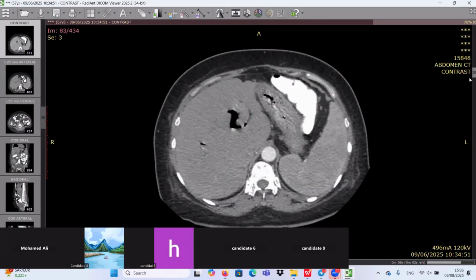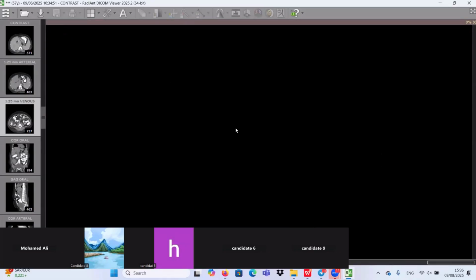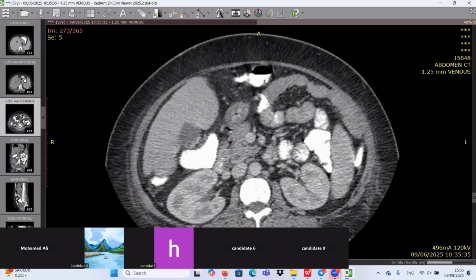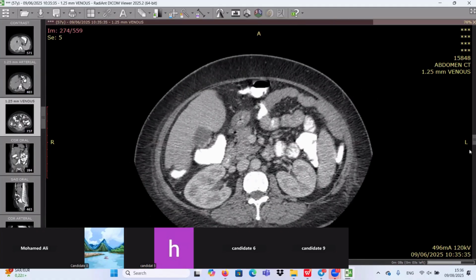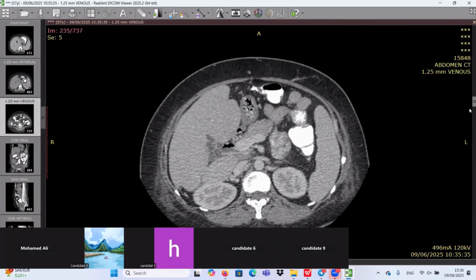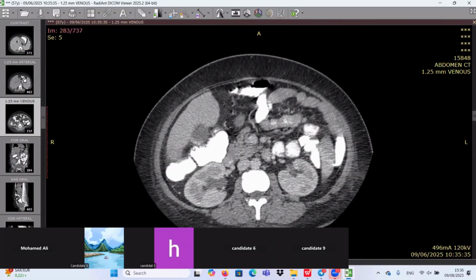I couldn't find any liver lesion. Yes, you should review the other organs. I would review the liver and the other organs. There are some incidental gallstones, but I would like to check the liver again. We have here some, I think, gallstones.